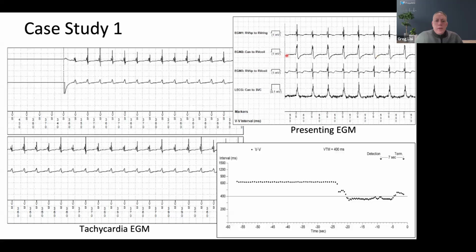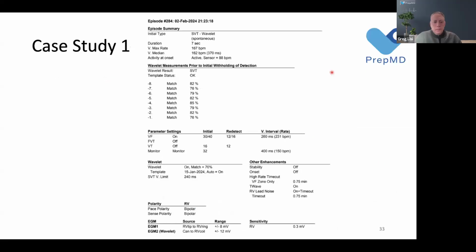I think sometimes people might be a little confused around looking at the far field signal. And one of the things to note here, as you mentioned, is just to remind people that the gain can be changed from one to the other. And so the height or amplitude of the signal is not always something that you need to get too wrapped up around. Right. The polarity is the same, which is really key. Right. Okay. Thanks, Greg.